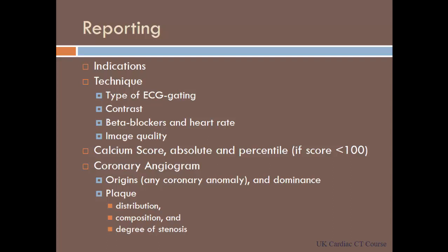Yeah. So if you have multiple lesions, basically it gives you the FFR through the whole artery. It will calculate FFR at every point, so it will show whether it is declining or not at different points. These images are very beautiful, and they give you a 3D model of the coronary arteries with FFR at every point, and you can bring your cursor to a point, and it will give you a value: this is the FFR at this point. So a lot of clever IT brain has gone into producing this technique.